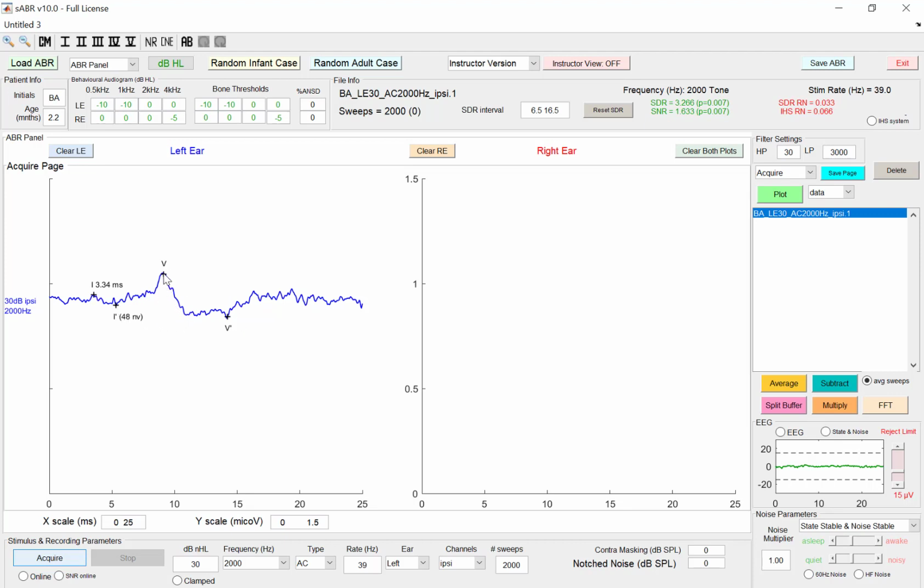The other feature is you can delete these as you did before, but it's just a right click to delete. And the other thing is that you can rename them. So if we put in a text label here, I'm just going to keep it as text. We'll put it right there, and say we want to maybe relabel that. We right click on the text label, and we'll just say relabel. I'm going to go ahead and it relabels it.